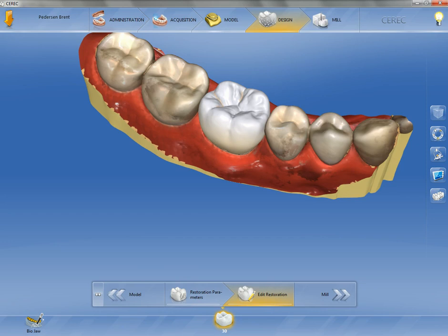Hello and welcome to a step-by-step demo of the Sirona Connect software. There are two ways to access it. There is a linking bridge inside this chairside software that allows you to transfer an open case directly into Sirona Connect. You don't have to manually export and import the scans. This is very helpful when the case dictates a change in plans.